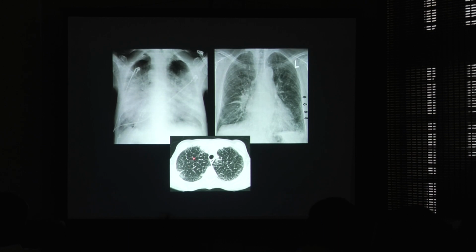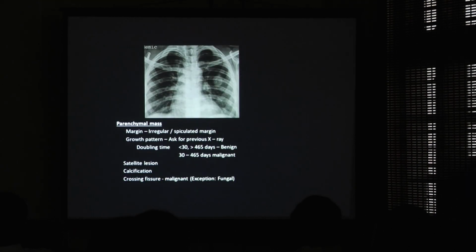This is how the thickened interlobular interstitium appears, like a polygonal shaped thing. Interlobular interstitial thickening indicates interstitial pulmonary edema. You can see fluid in the fissure, and also you can note the upper lobe diversion of blood flow. These are evidences of pulmonary edema at a stage earlier than the alveolar pulmonary edema.